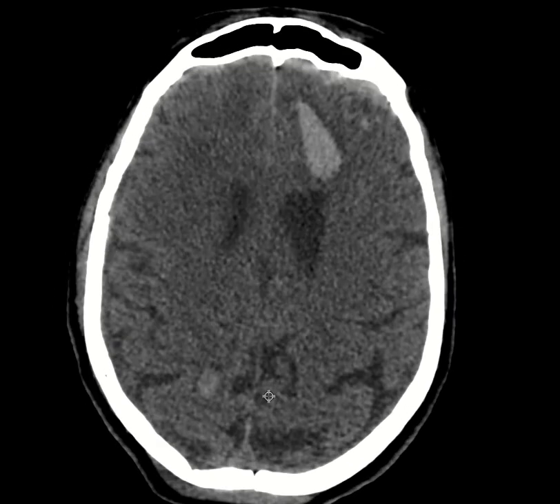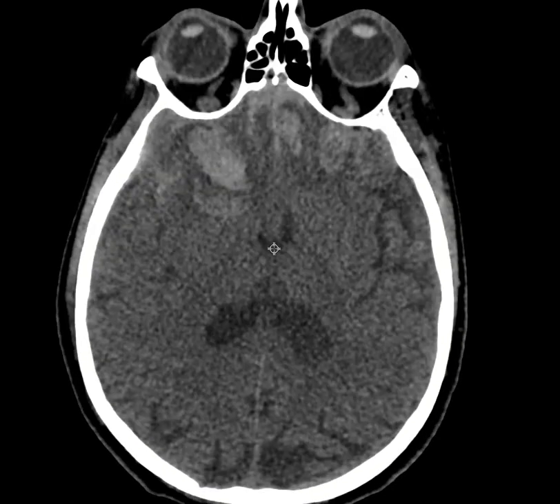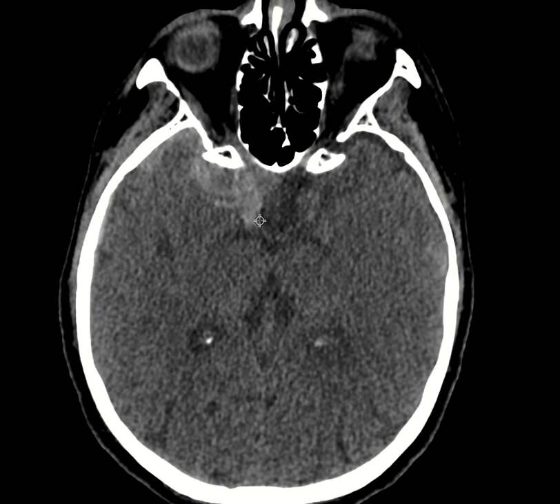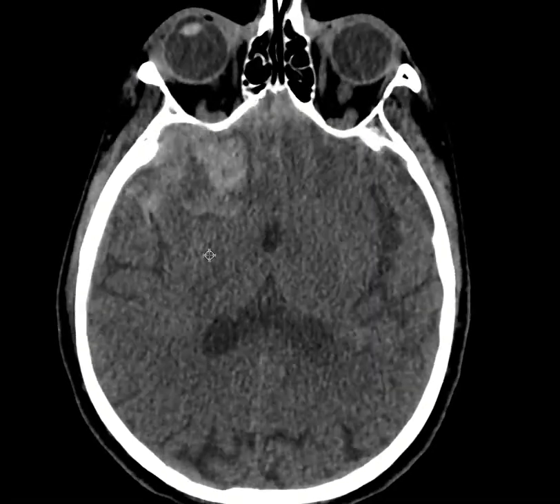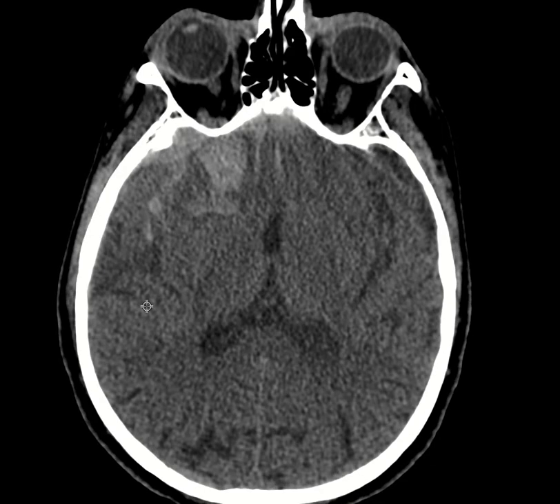Then the other type of hemorrhage that we usually see in the setting of trauma is subarachnoid hemorrhage. If you look at your cisterns, this is a suprasellar cistern, and we see some areas of hyperdensity. These are subarachnoid hemorrhage about the suprasellar cistern area, and this is the MCA cistern that we have subarachnoid hemorrhage in. And the other common area is the Sylvian fissure. This person doesn't have Sylvian fissure hemorrhage. He has it higher up here, but we don't have it in the lower bottom.